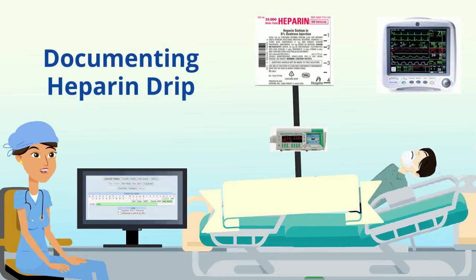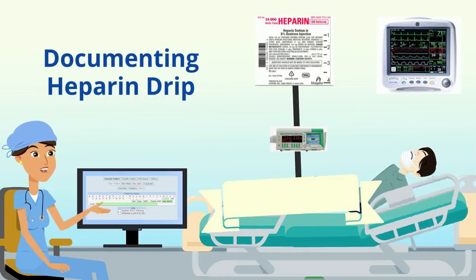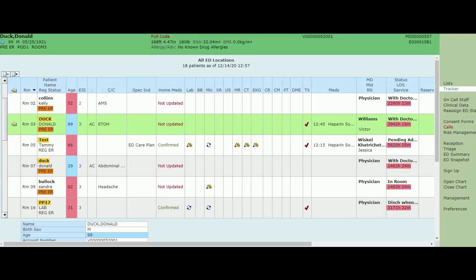Hi nurses, this is a quick review on your heparin drip. One of the things that makes it easier to follow a heparin drip accurately is to make sure that the weight is entered in kilos.